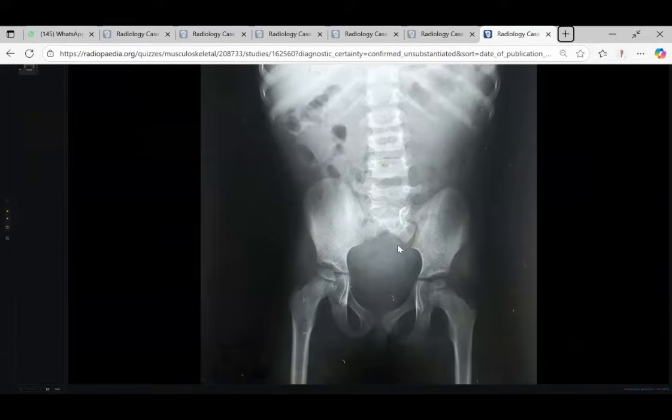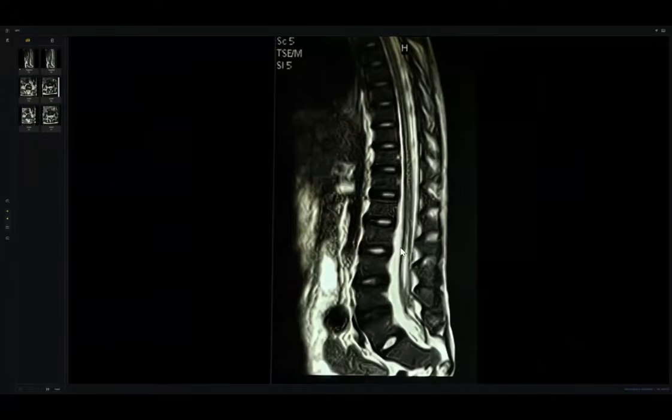What happened here? No coccyx or sacrum, just S1 only, and even spina bifida here. And if you look here, even the wings of both sacral sides are very small. Besides that, you feel there is some asymmetry between both pelvis sides. So we are dealing with caudal agenesis syndrome or sacral agenesis syndrome. So he gives you, or you request, an MRI.